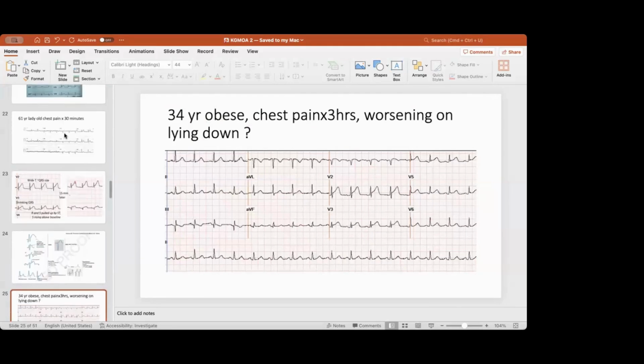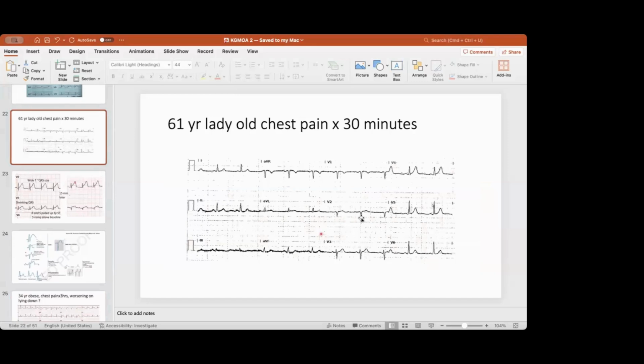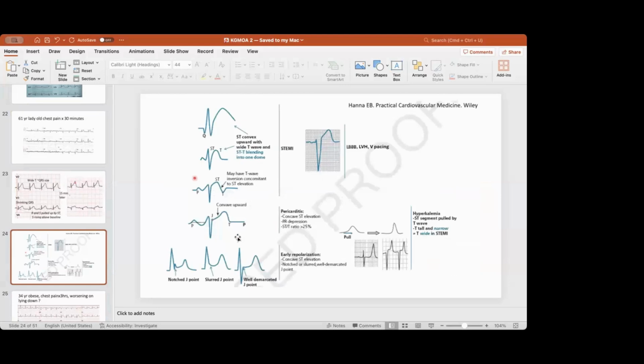Q wave. This is QS, in V1, V2, QS. QS means Q. This is a Q wave. QS complex. That is all there is. QRS: first negative deflection Q, R wave, S wave, followed by ST segment, like a triphasic wave. This is a full Q, or QS complex, ST segment. This is a Q, this is S, this is QS complex.